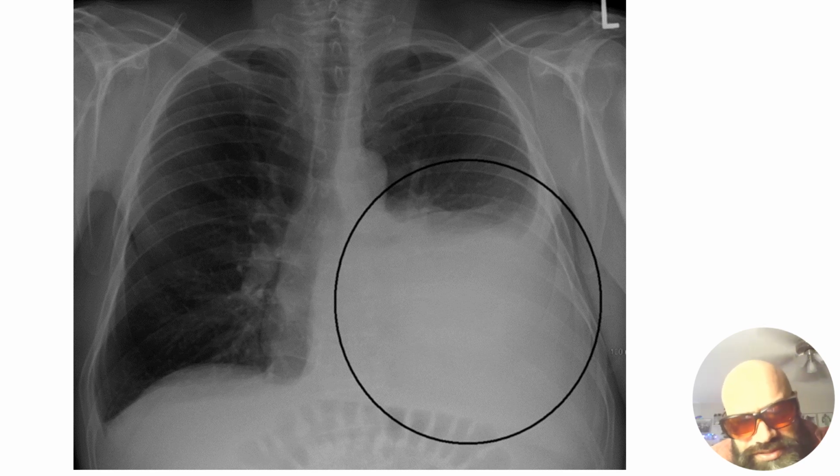It also obliterates the cardiac border along the left ventricle as well as the left hemidiaphragm region, and you can see that the left costophrenic angle is completely absent in this situation.